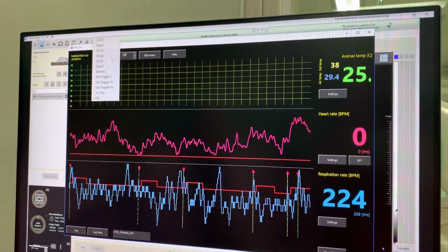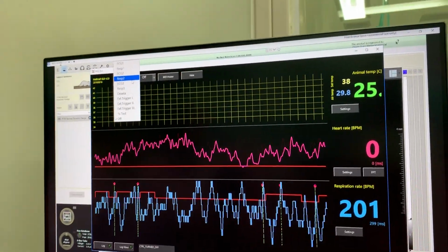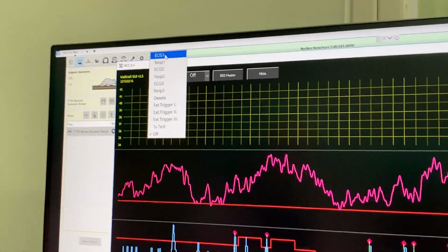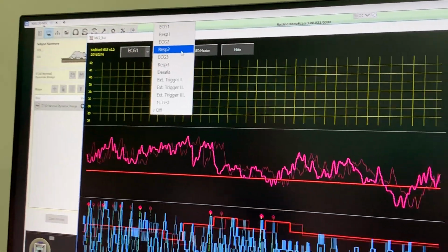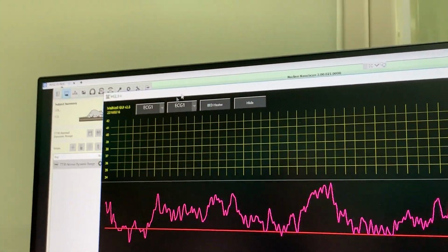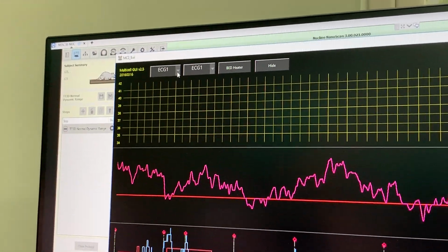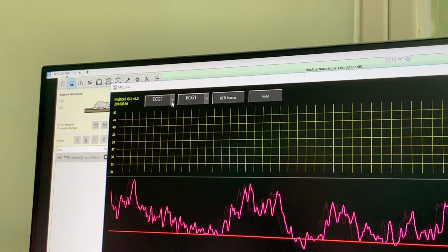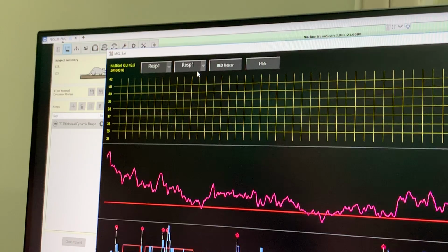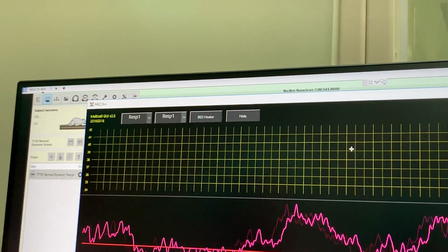There are 2 channels we will use to trigger the acquisition. The first one is the ECG one, and I think the second one is for the MR triggering. The first one is for the SPECT or the PET, but just to stay on the safe side, set both, either ECG1 or RESP1, depending on the purpose, whether you want to do a respiratory or ECG gating scan.